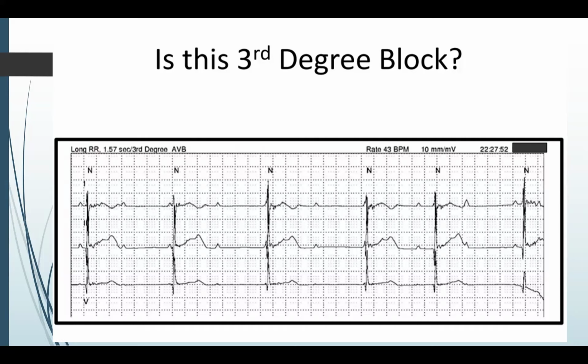So first off, it's a pretty short strip, so I think that poses a challenge in determining if something is third degree. Often it's hard to distinguish high grade second degree block from third degree block in short rhythm strips. That's true. A couple of things kind of stand out for me.